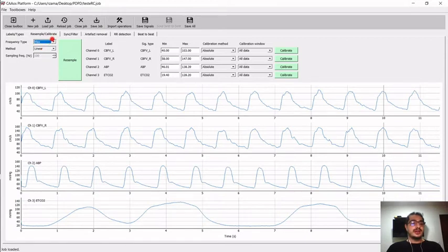On the other hand, if we select the minimum, the platform will make both signals with the lower sample frequency, which means a frequency of 50 Hz. In addition, we also have the custom option, which enables the user to choose the sample frequency according to what the user wants. To do that, we go to sample frequency, and you can increase or decrease the value, or we can write right away, for example, 90. But I will leave as 100.